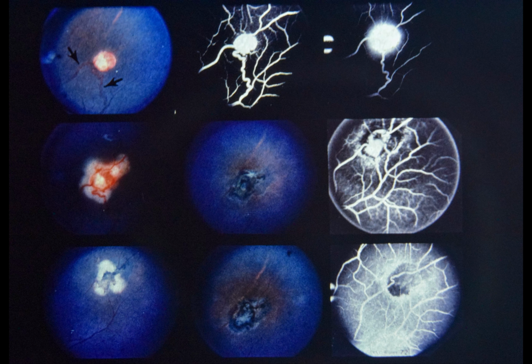More than 1 treatment episode is usually required. In general, one should treat lightly in order to avoid severe ablatio fugax or exudative detachment, which can occur even after mild treatment. This case illustrates the importance of fluorescein angiography in evaluating the vascular patency of the tumor even after apparently successful closure.